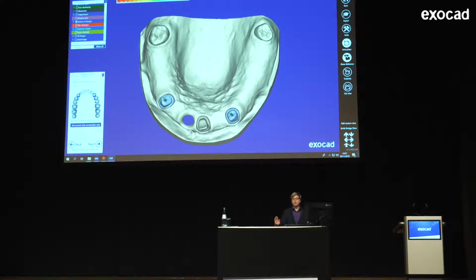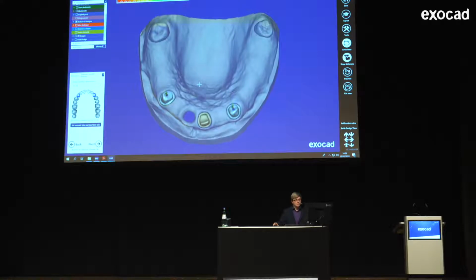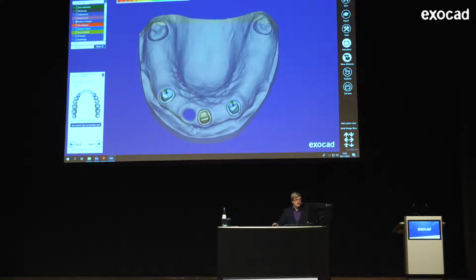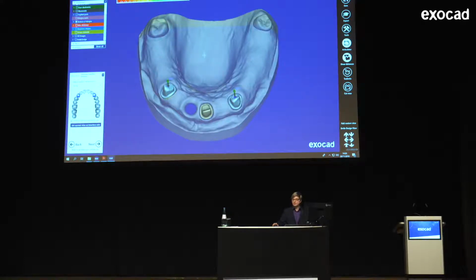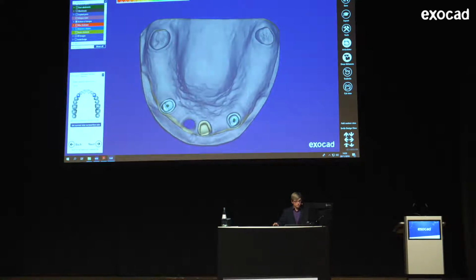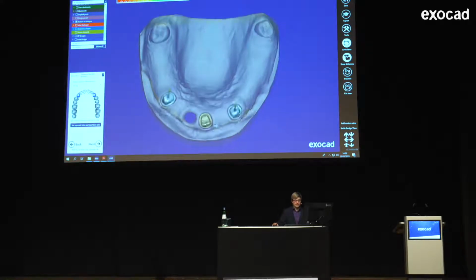It's never really working the way you would want it to work. And here, if I'm making the model a bit transparent, I can actually see undercuts here, because at the end, I'm going to place clasps here. But you also see, I can't really get undercuts on this teeth without tilting the model completely, and this is not a good insertion direction. So I'm choosing something like this, where at least here I have some. And they're also a bit in unison with the dies themselves.